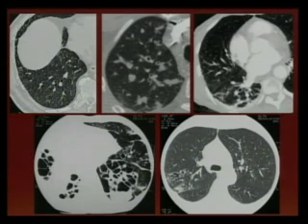As I told you, in normal cases, when we are checking the high resolution, the bronchus and the pulmonary artery have the same size. When one of the bronchi is more dilated than the vessel, the pulmonary artery, we can call that bronchiectasis. Here we have a typical appearance of the signet ring sign, and you can see the ring, that is the bronchiectasis, and the signet is the pulmonary artery that is close to the cystic lesion.